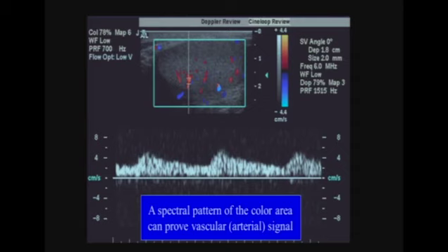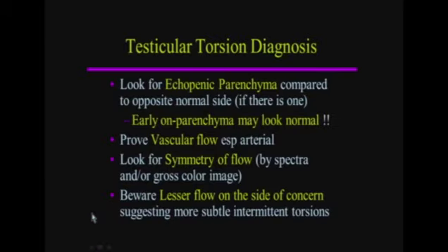One will see either decreased vascular flow to the testicle in an intermittent or a partial torsion. One may see no flow whatsoever in a complete torsion. Some people believe, looking at dog experimentation, that there should be a 540-degree twist or greater to completely lose vascular flow.